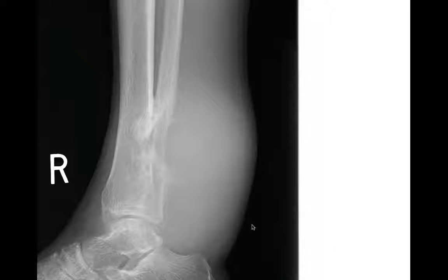This one doesn't really have a lot of periosteal reaction. You see there's some bone which is lifted up from the cortex right here and extending out. You get the sense there's this giant soft tissue mass associated with it right here. So this one doesn't really fit nicely into our descriptors, but perhaps it looks a little scary just because of this giant soft tissue mass right here.